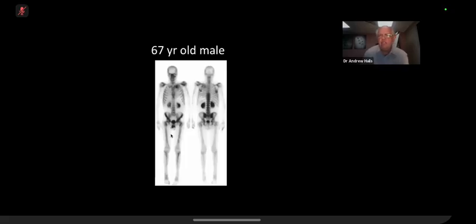Okay, I'll point out that what we're really looking for in this case is decreased uptake. This patient's had radiotherapy, so you go up their spine and then there's an abrupt, non-anatomical cut-off there with very little uptake here. Obviously you want to look at plain films and know more about the patient, but this was really just to demonstrate that this abrupt end of uptake is what you would see with radiotherapy.